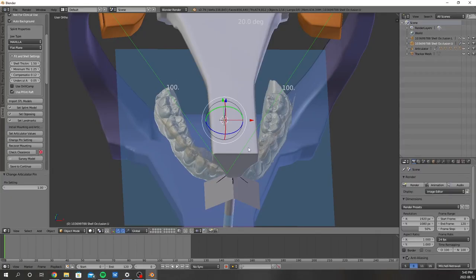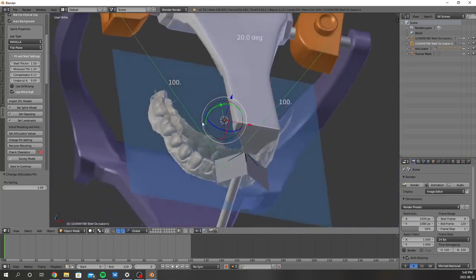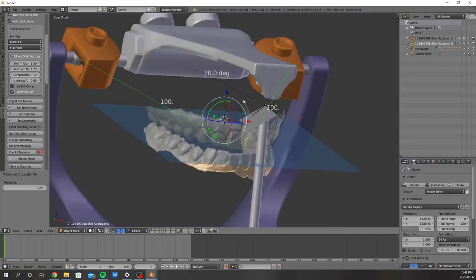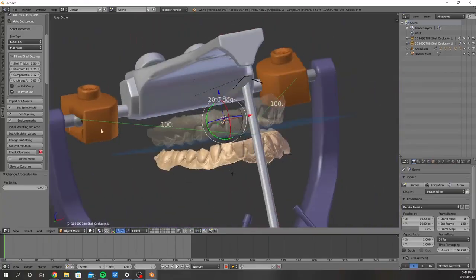But say I went too far. Okay, now we have nothing there, right? And so maybe I'm 0.9 too open. So what you're going to do to close it again is you just go into the negatives. Perfect. A little bit there. That's fine. And that's not too thick once we're good.